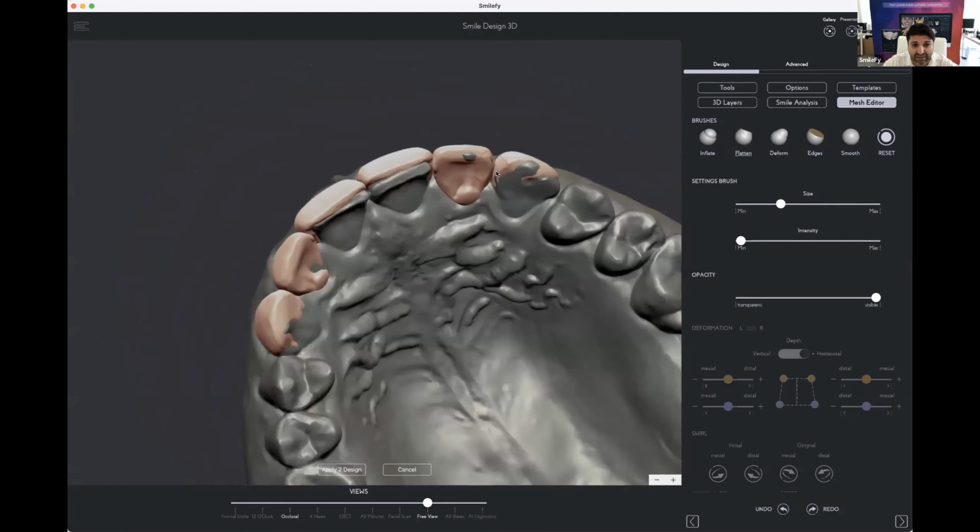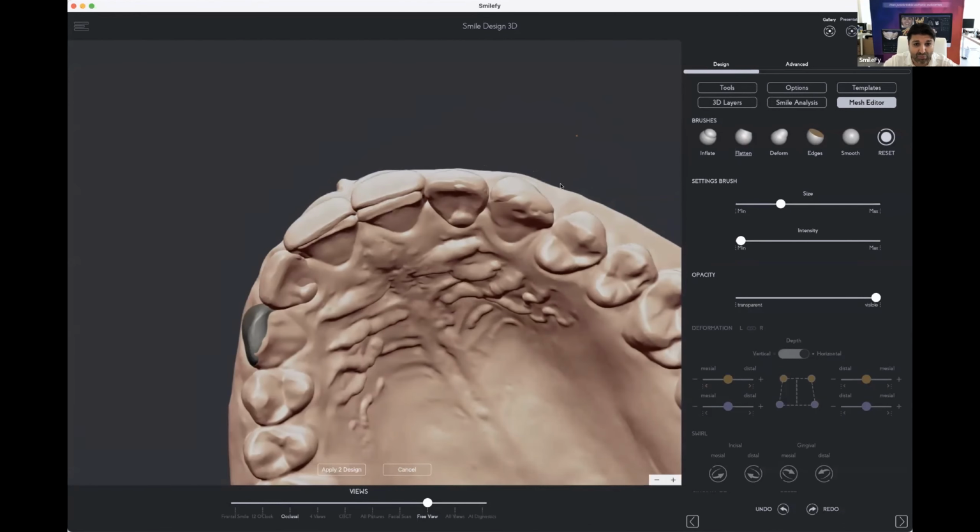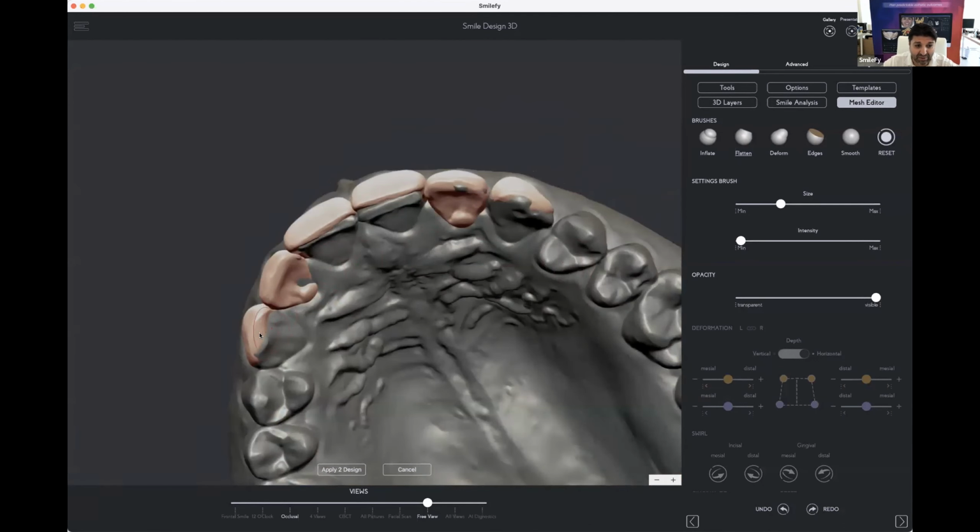I'm going to flatten this tooth here, like this. This one I can keep as a stabilizer. I'm going to delete this one. So for our shells, you are going to have these 6 teeth as one file, but the laterals are going to have the stabilizer for the incisal edges.